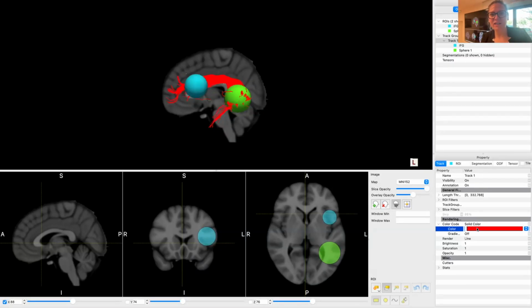And the classical color for the long segment is red. So that is your arcuate. You can already see anatomically that we're going beyond Broca's area in the frontal lobe. If you use a classical DTI acquisition, as Flavia explained this morning, then the arcuate tends to end in the ventral premotor, posterior Broca's area.